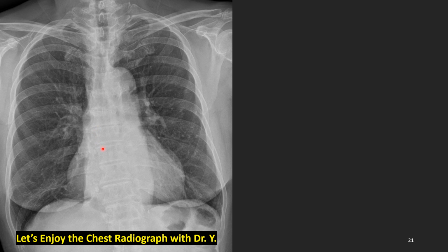This is another case of right lower lobe collapse. Small, elongated shape of triangular right lower lobe collapse here. Dense collapse with internal calcifications here. Clear right heart border and somewhat hyperinflated right lung and small right hilum shifted here, and several small specks of calcifications telling us this is tuberculosis, right?